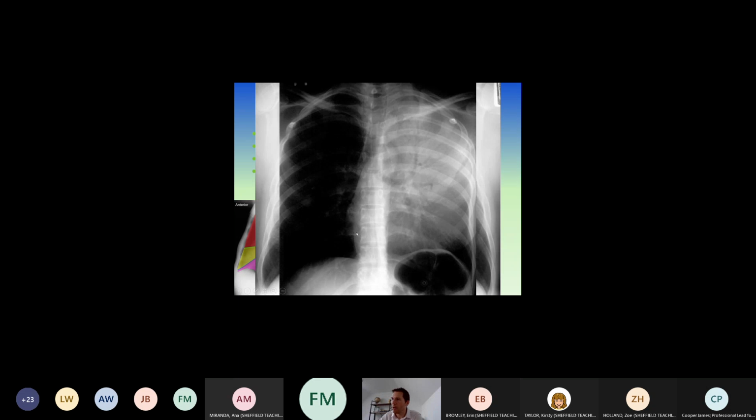Upper. Perfect. So whatever this pathology is, it's consolidation again, and we'll talk about that in a few minutes. So we can say for certain this is left upper lobe consolidation. The hemidiaphragm is completely preserved. There's no consolidation in that lower lobe there.